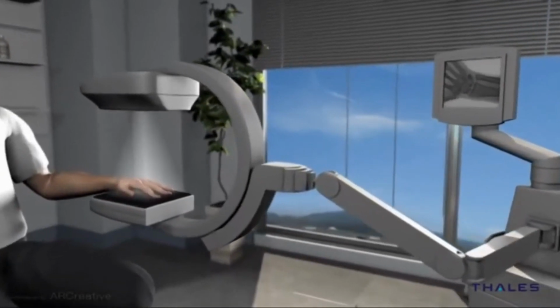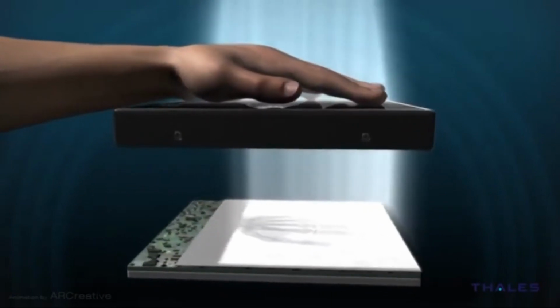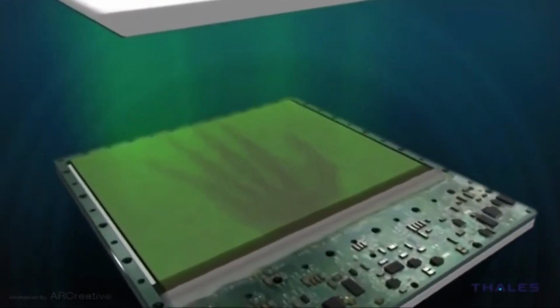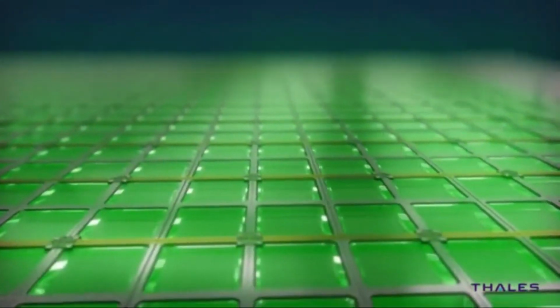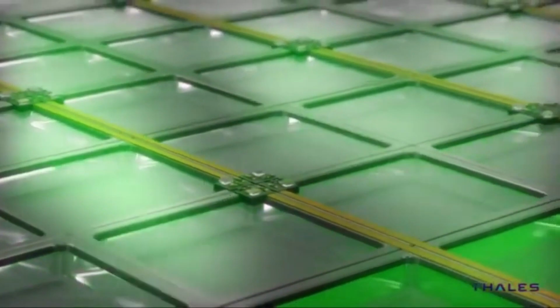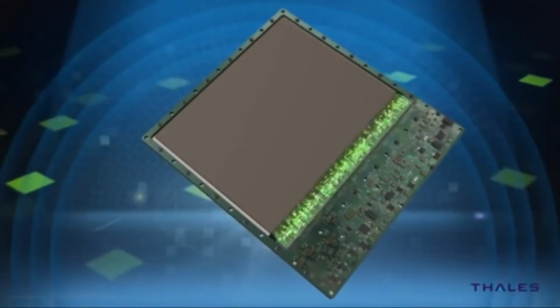The second type of detectors are direct FPDs. Direct conversion imagers utilize photoconductors such as amorphous selenium to capture and convert incident X-ray photons directly into electric charge. X-ray photons incident upon a layer of a-Se generate electron-hole pairs via the internal photoelectric effect. A bias voltage applied across the depth of the selenium layer draws the electrons and holes to corresponding electrodes. The generated current is thus proportional to the intensity of the irradiation. The signal is then read out using underlying readout electronics, typically a thin film transistor or TFT array.